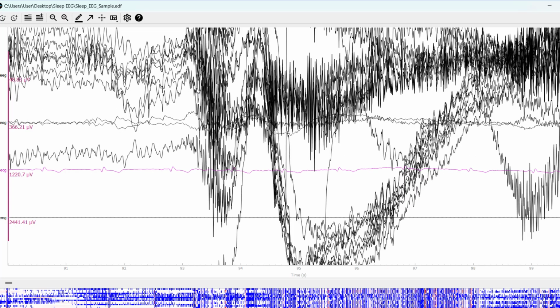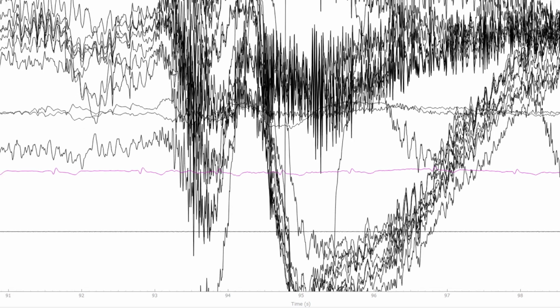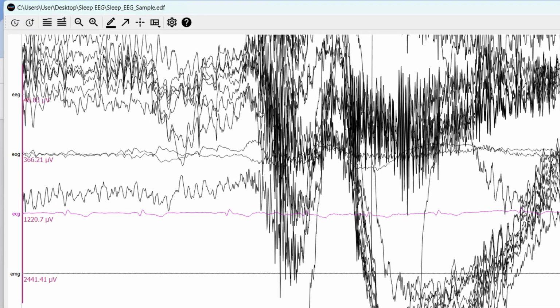Alright, my friends, that brings us to the end of this session. We explored almost everything you need to confidently use the interactive EEG browser in MNE. We first learned simple navigation and scrolling. We also learned how to change duration, how to select different channels, how to filter on the fly, using themes in the Qt backend, and working with the overview bar and understanding advanced options like Z-score mode and annotations.